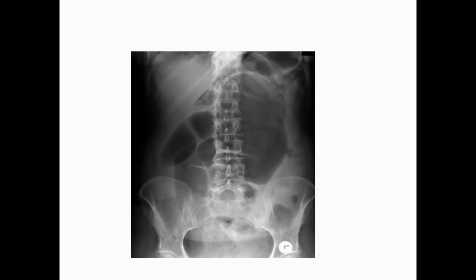When that part is not covered, it might undergo twisting and volvulus. So this is one case of cecal volvulus, with dilatation of the cecum. Ideally, the cecum should be in the right iliac fossa, yeah? But if it becomes massively dilated, it will come to the midline and might even extend toward the left iliac fossa.